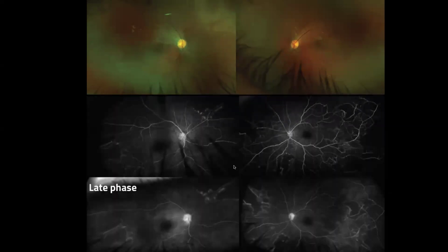Okay, same thing here. The retinas are relatively unremarkable when you just take a picture or just take a look. But when you do an FA, kung standard field lang, medyo unremarkable din. But the periphery suddenly reveals a lot of vasculitis with capillary non-perfusion. So this is up and coming. Hopefully more centers get more ultra-wide field imaging machines.